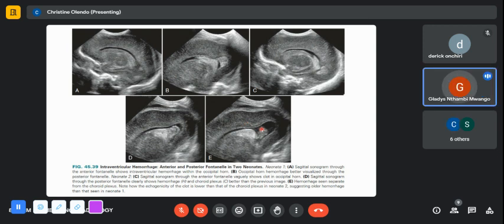What else you can do is coronal images. If you're at the level of the choroid plexus, you have both choroid plexuses and can compare the way they look. If one looks larger, more bulgy, you can suspect a grade 2 germinal matrix hemorrhage, because usually the hemorrhages will never be symmetrical, but the choroid plexuses are fairly symmetrical. But what you're saying is true about it liquefying with time and looking different.